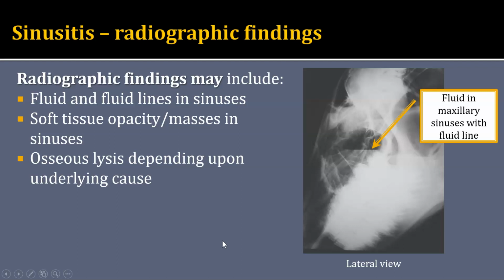We might also look for soft tissue opacity or masses in the sinuses, and then whether or not there are osseous changes. Seeing lysis, or even potentially proliferation, will depend on the underlying cause.